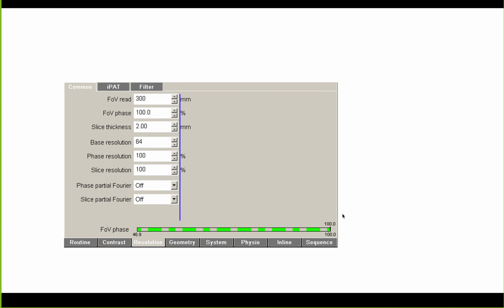All right. So let's jump right in. As I told you, we are interested in this back and forth pattern in K-space. And the way this back and forth pattern to acquire EPI works is determined by these parameters that we usually see in the so-called protocol editor. Here I'm showing you a screenshot from a VB17 7T Magnetom scanner that we have available here in Maastricht.